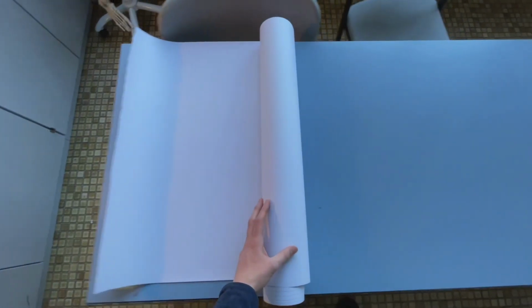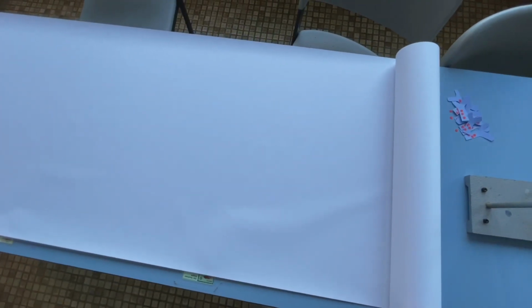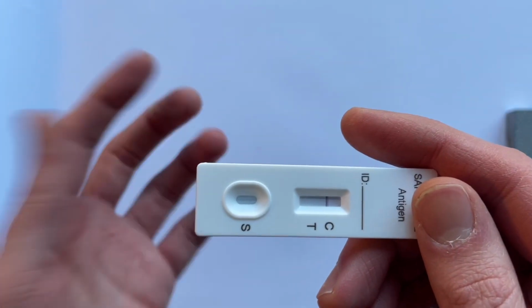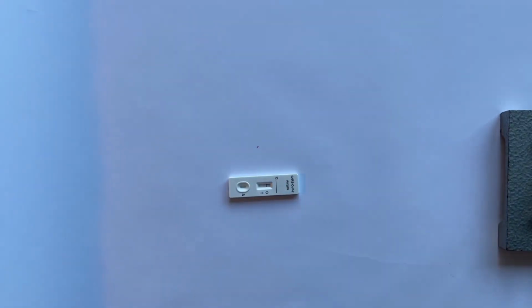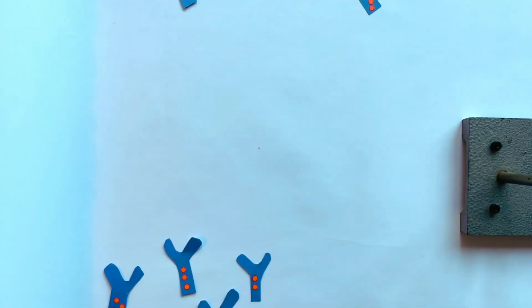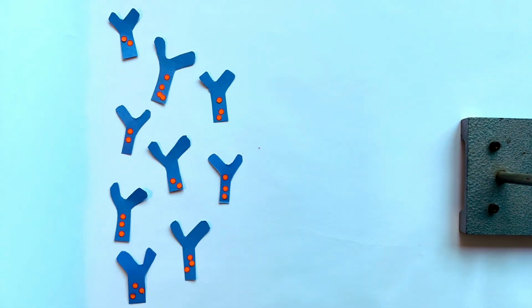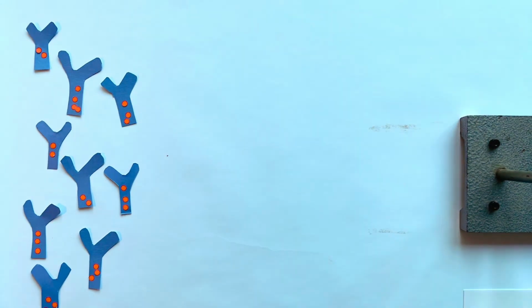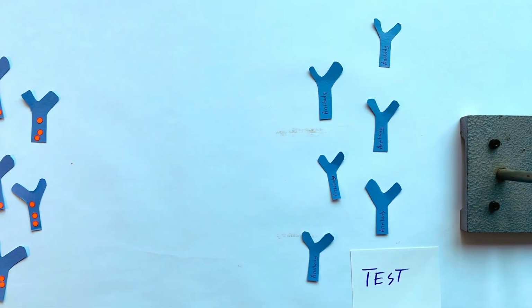All right, we're gonna imagine that this piece of paper is our antigen test. So this side of the paper is going to represent where we put our snot into. So the people who made this little rapid test put those gold-colored antibodies inside of that well that you drop your snot into. Then they created a test line with antibodies that aren't gold-colored.